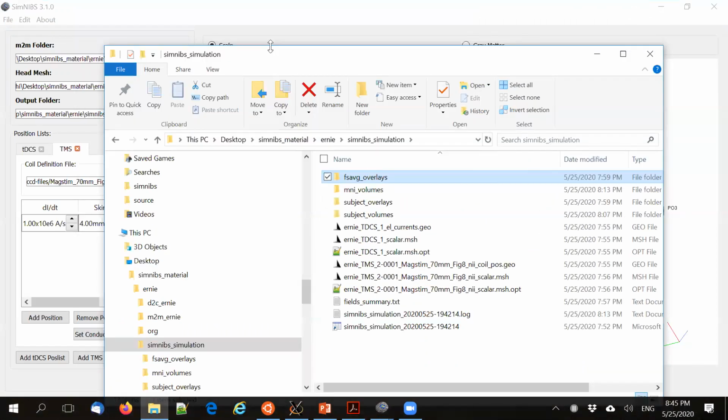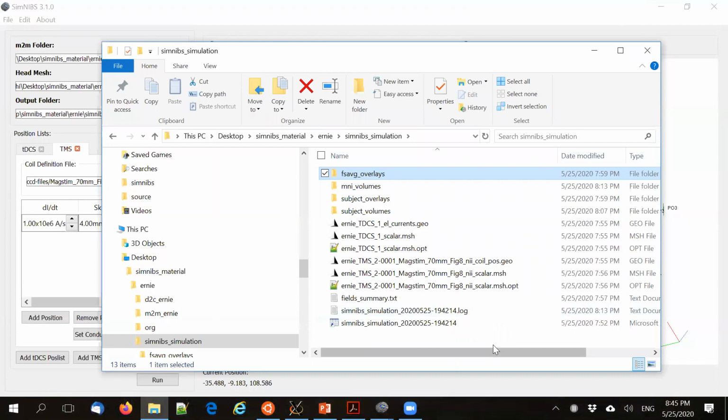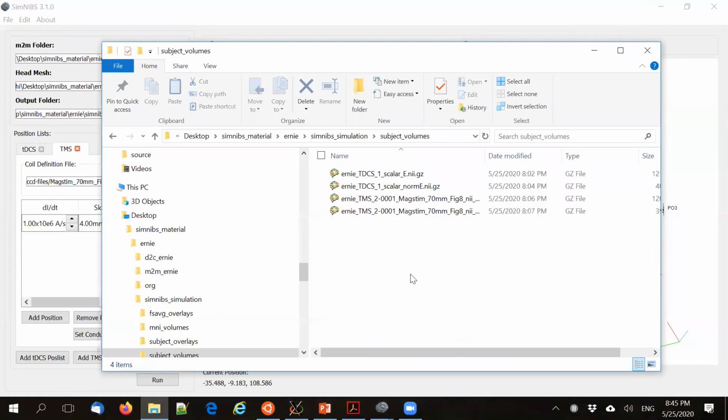The last thing is that often NIfTI volumes, so voxel space, is preferred. We also support that. We can look either into the individual space of the subject given by the individual T1.